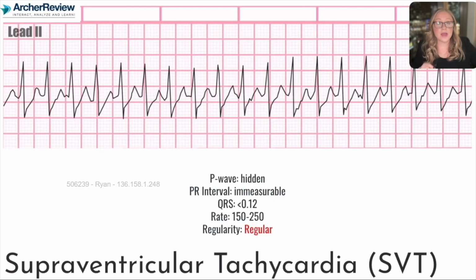All right, our next and last atrial rhythm is something called supraventricular tachycardia. Now, I know it's got the name ventricle in there, so you're probably saying, hang on, Morgan, this is a ventricular dysrhythmia. It's not. Supra means above. So this dysrhythmia occurs just above the ventricles. This is one of the more common things that we can see post-operatively. And what happens is we get a really, really fast ventricular rate. It's so fast, in fact, that it hides our P waves.